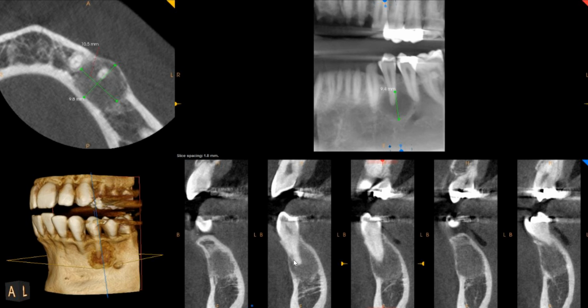So let me make my case for this being a simple bone cyst. What it doesn't fit well is this expansion. Typically, a simple bone cyst doesn't cause expansion, and it's difficult to evaluate scalloping features, but I do like the fact that it's not well corticated, and the fact that simple bone cysts do heal from time to time spontaneously. So there is just too much missing information.